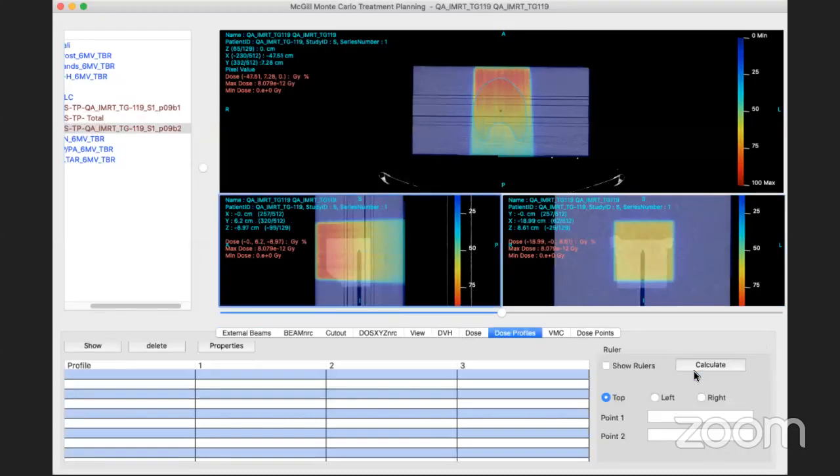And to show it better, let's try this, minus 50. So 0, 0, okay, doesn't matter. This is 7, we'll put 10.